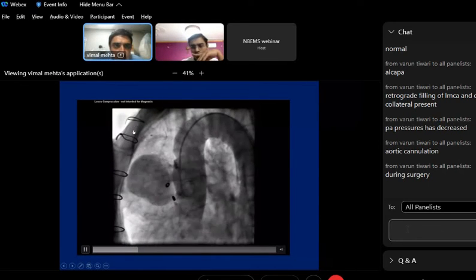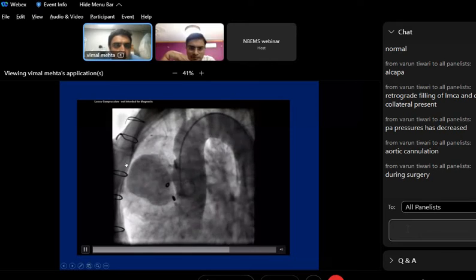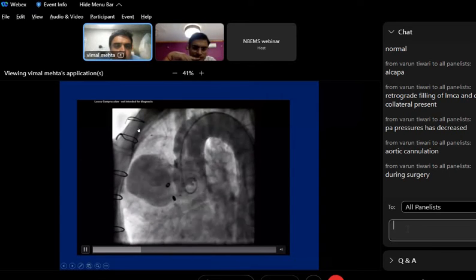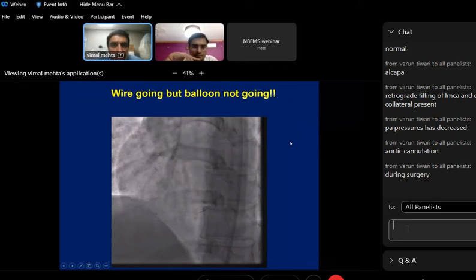You see these sternal wires, because we know that after surgery the sternum never fuses and you have to keep that in place. So the patient had some sort of surgery, and you see these markers of surgery. So this is important, post thoracotomy. So you have to mention.